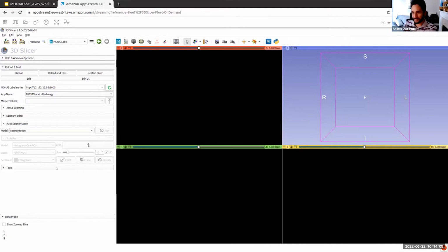So this is the basic MONAI Label module. If you want to know the hyperparameters of the network, how many epochs, the learning rate, the type of data set that you want to use, and by data set I mean the class to load the data and do the training, this is more for the researcher persona.